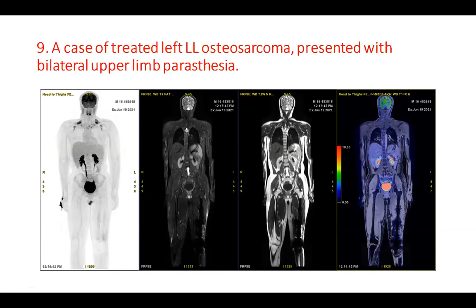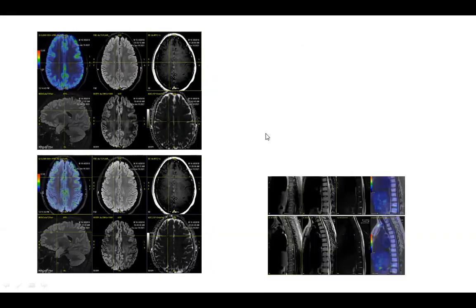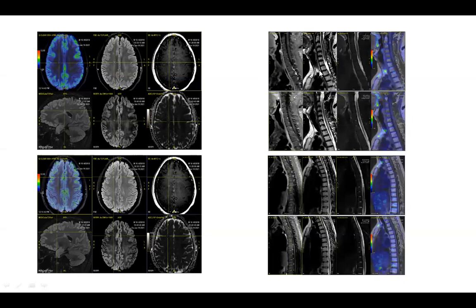The patient showed no de novo lesions, no metastatic involvement elsewhere in the body, but what we found that explained the patient's symptomatology were these foci of bright signal on FLAIR and T2 weighted images. They are these small foci seen here at the centrum semiovale region and bifrontal subcortical regions, together with lesions within the cord. The patient turned out to have primary demyelination.